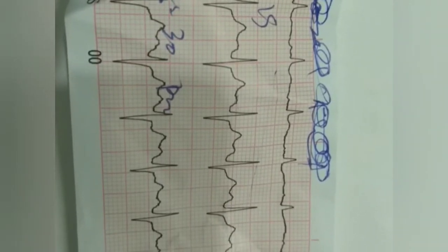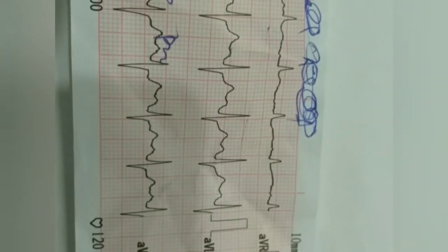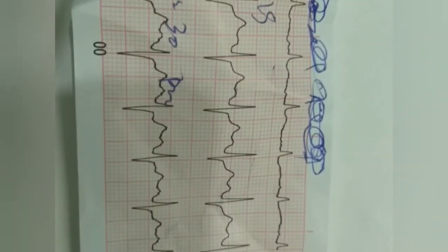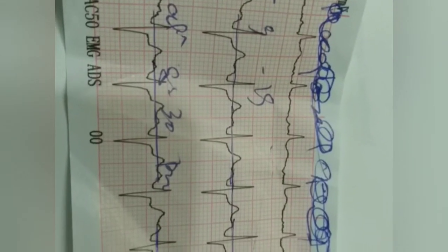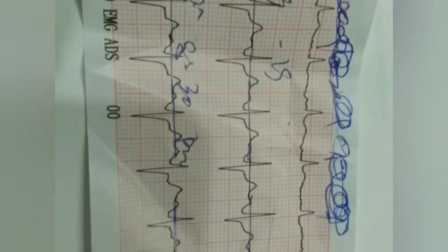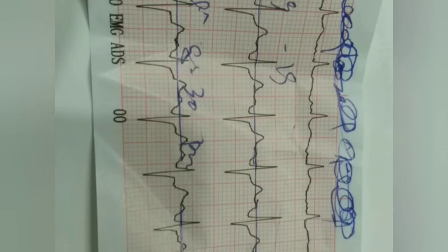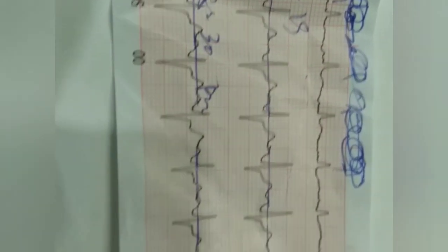So here the isoelectric line, which is between T and P wave, you draw a line and then you will see, is there ST going down as compared to the isoelectric line. This has now become a little bit more prominent. Patient having pain epigastrium and sweating, and this ST elevation, which can be actually overlooked by so many doctors, is actually present in the ECG of the patient.